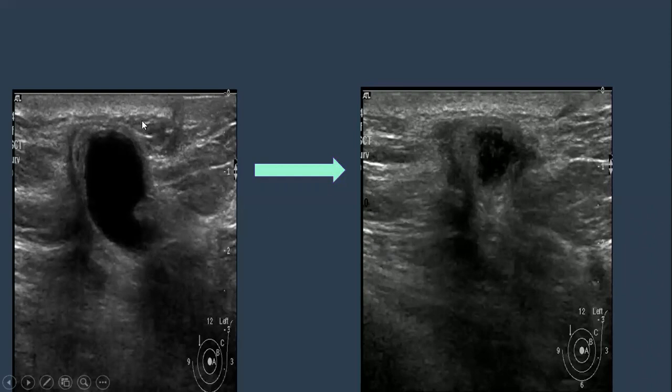So this is the baseline post treatment. Inflammatory mastitis, post radiation mastitis. But what exactly is inflammation giving you? Lucency on mammography and hyperechogenicity on ultrasound, and giving calcification simulating cancer, and the calcification will grow by time.